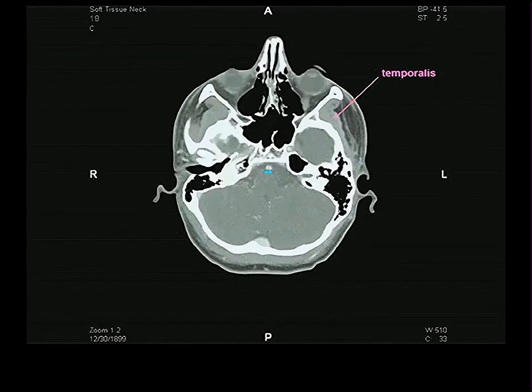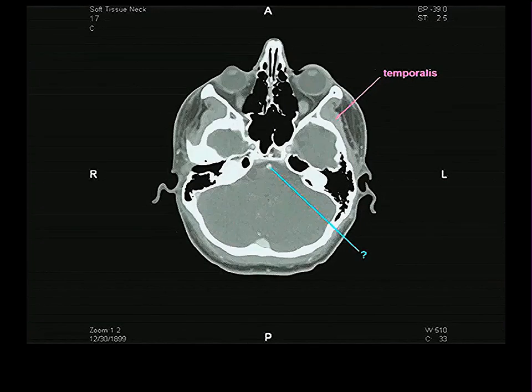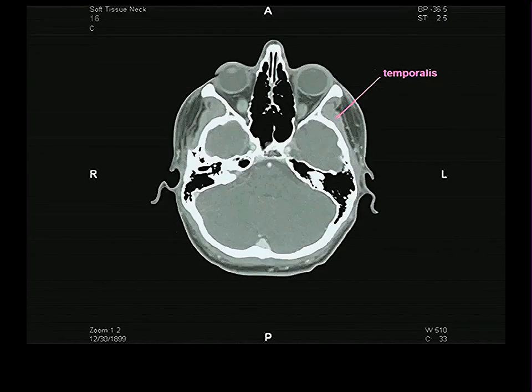And then this. What is that? The basilar artery. Everybody knows that. Excellent. And we've lost the masseter, we've lost the medial pterygoid, we've lost the lateral pterygoid. The only masticatory muscle which extends superior to the zygomatic arch is the temporalis. I've been labeling it, but I haven't been talking about it as we've come up.